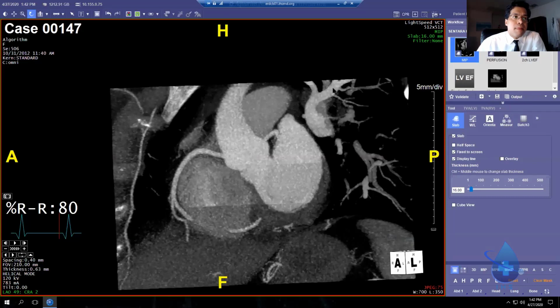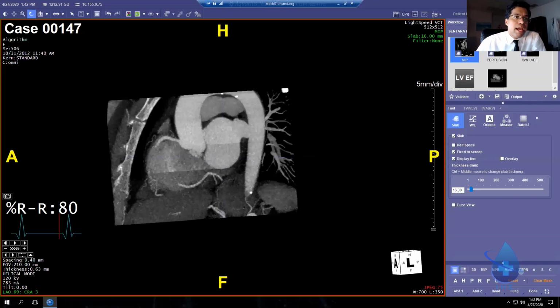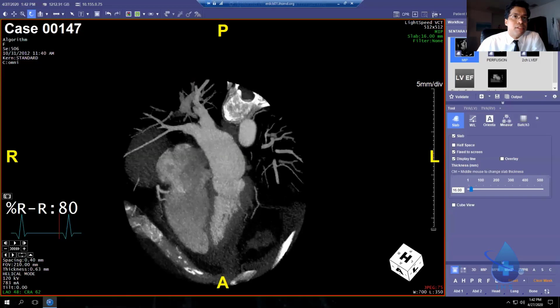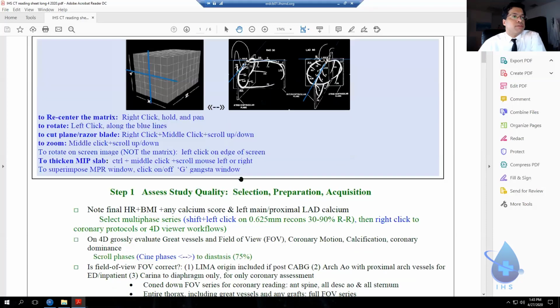To do that, recognize that this reconstruction is cutting off the aorta. We asked the techs to scan the patient one time, but to do one reconstruction that cones down on the heart, that was this reconstruction. We asked them to do another reconstruction here that had the large field of view, okay? So that's the one we need to open to get to step 3 in the algorithm. Before I get to step 3 and we start doing the housekeeping, let me pull that PDF back up one time. These were the mouse moves.